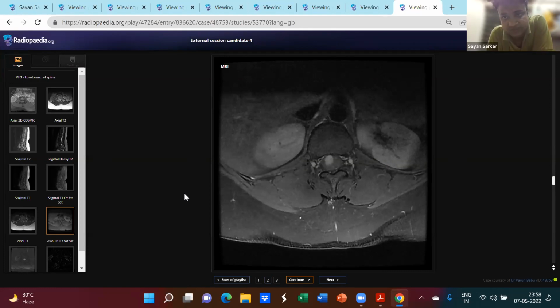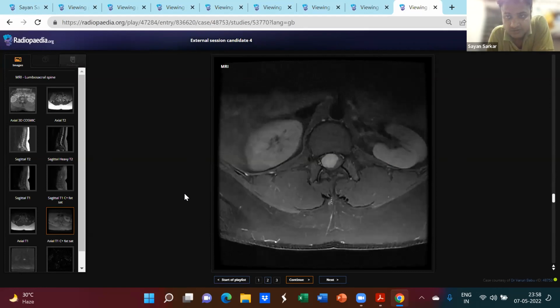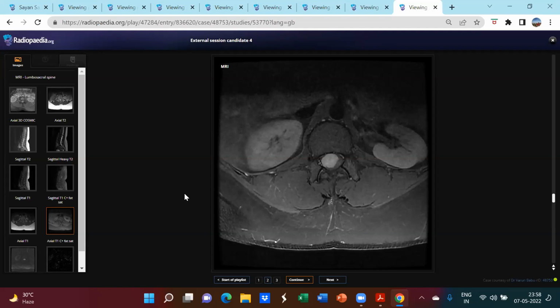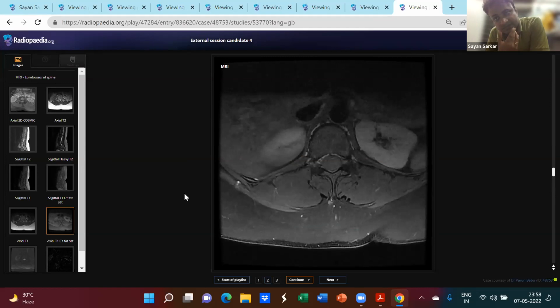That's fine. I'm just saying, neural foramina of what? You're already seeing the lumbosacral spine, right? Yeah. The entire images of the lumbar spine that are available. And if I see multiple lesions, I would also like to look at the thoracic spine. You can just see the whole spine, right? Yeah. Okay. Apart from the whole spine?